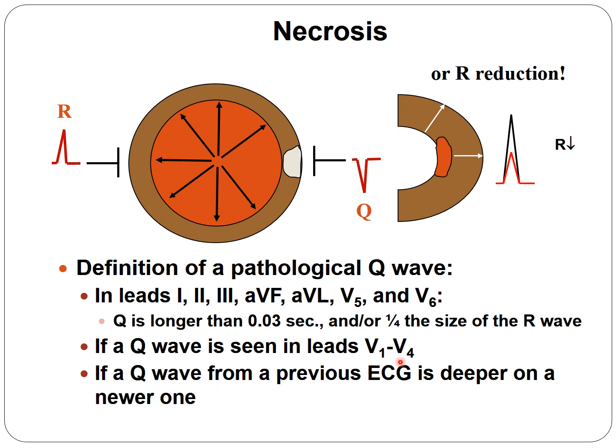Another thing, if the patient had an ECG recording where there was no Q wave, and now that Q wave is there or deeper, and the patient has typical pain, you have to consider that the patient has necrosis.